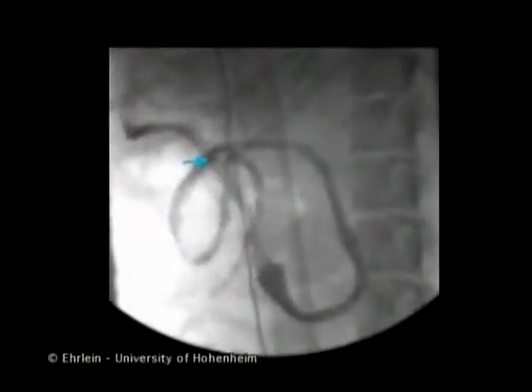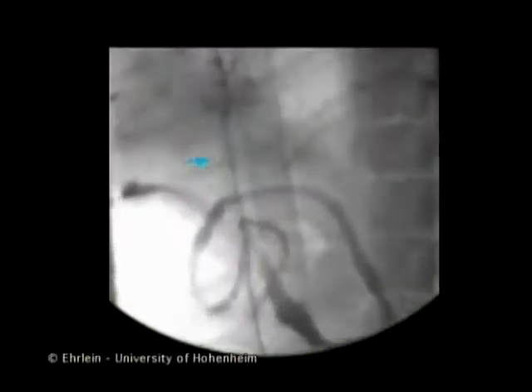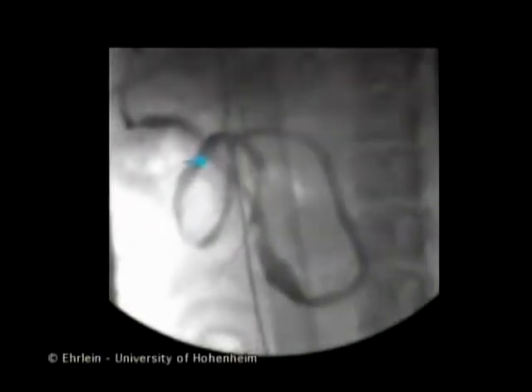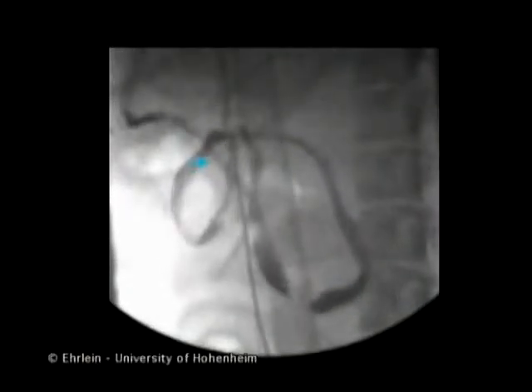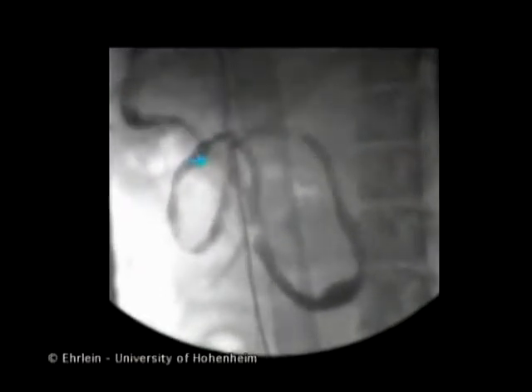When the peristaltic waves have reached the proximal jejunum, the phase 3 begins to migrate aborally. This is produced by each subsequent wave starting and terminating a few millimeters further distally. Here we observe the aboral region of the peristaltic waves and see the aboral migration of the phase 3.